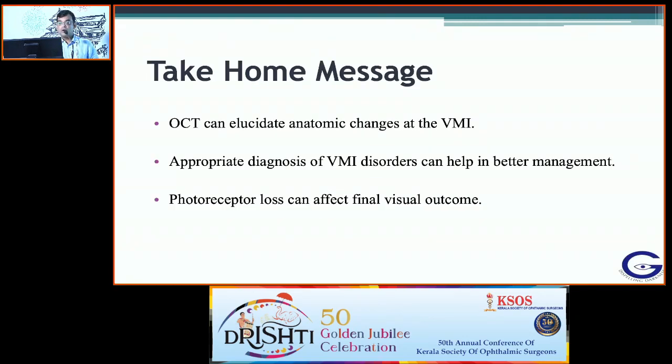So the take home message is that OCT can elucidate anatomic changes at the vitreomacular interface. Appropriate diagnosis of these disorders can help in better management and understanding for our treatment. Photoreceptor loss can affect final visual outcomes.